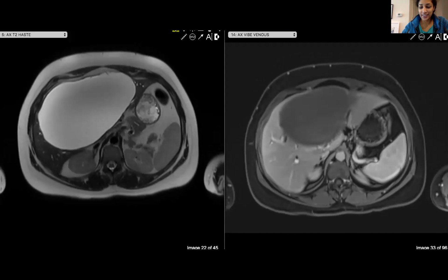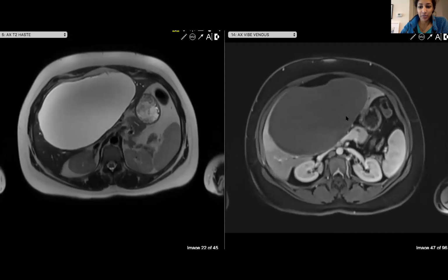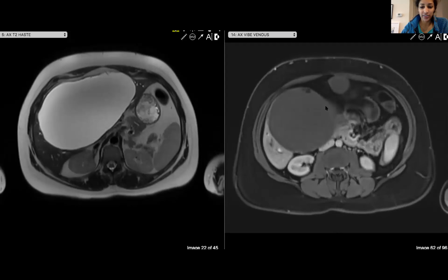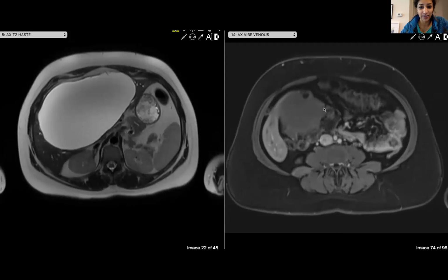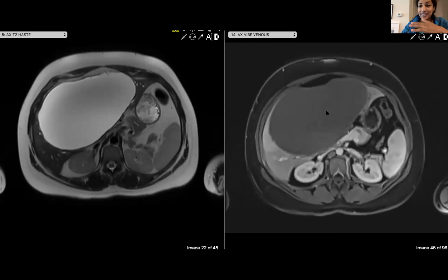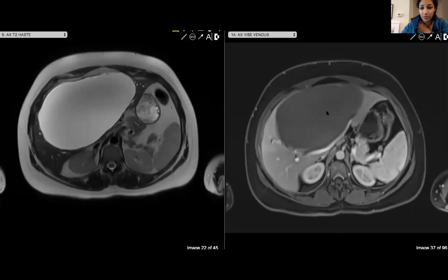Okay, so Justin is guessing an MCN, and Gitanjali is saying a mesenchymal hamartoma. Good. So that's basically our main differential here, which would be, is this a cyst or like a cystic hamartoma, or is this a mucinous cystic neoplasm of the liver? And the clues here are that, as I told you, it was a younger middle-aged female. So that will be one of the clues.